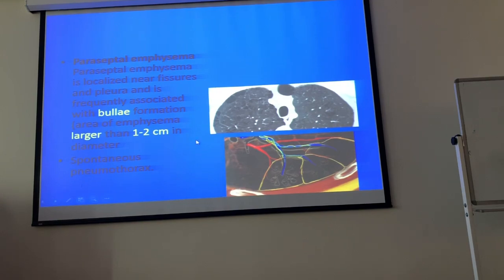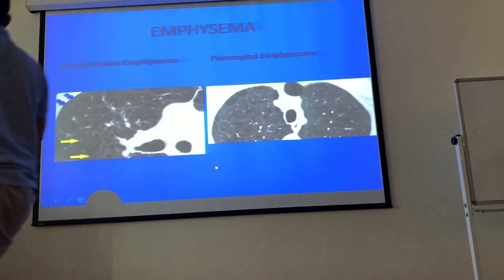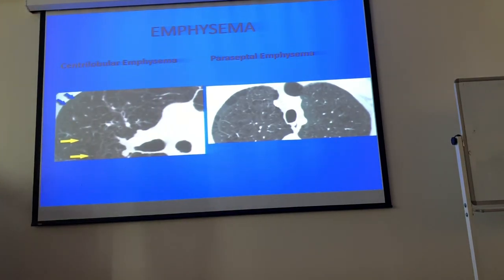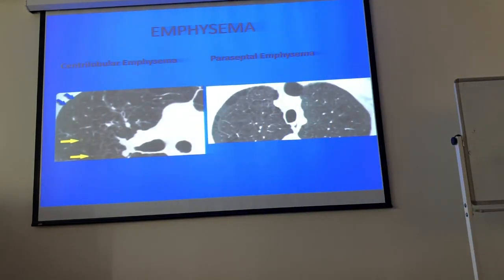Now again, this is the same structure. So centrilobular emphysema, you can see the lobules, and the center of the lobule is involved.